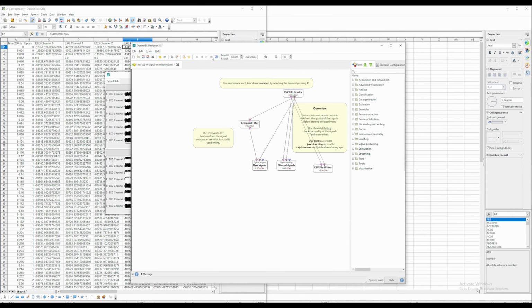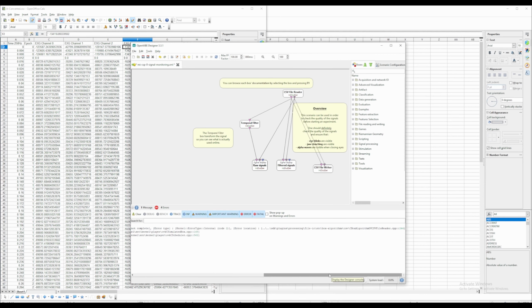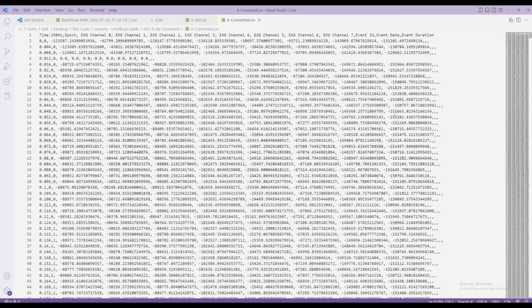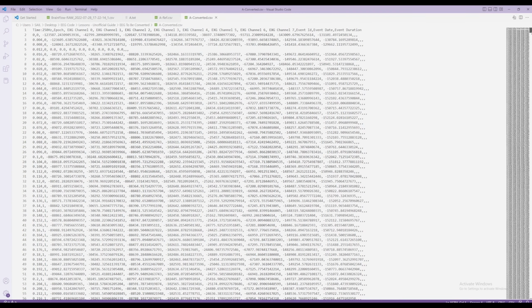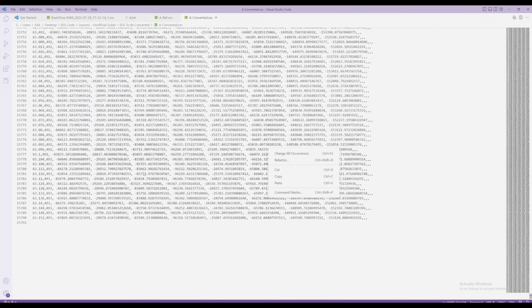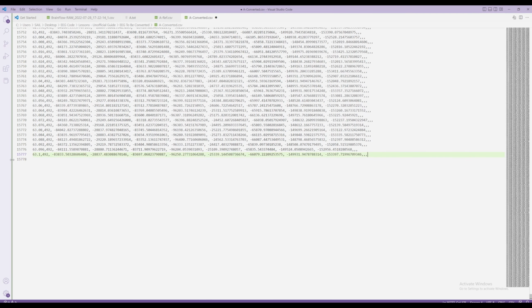But if I fast forward, yeah, there we go. So it will exit the scenario and throw an error. And it says that missing data in file may be corrupted, details chunk is not complete. So we can actually go ahead and fix that. We can do it in a text editor as well, because it's only the last samples that are affected. So here we see 493. All right, so we just have to get rid of all the samples after 492. And this way we will not receive that.